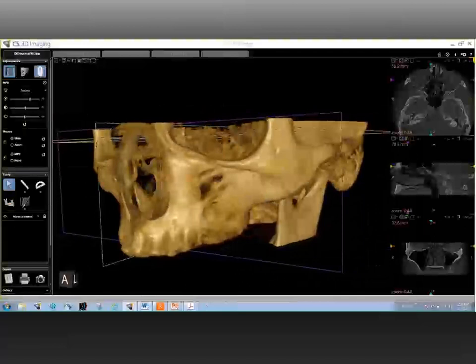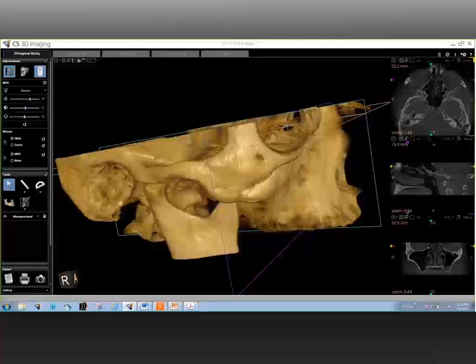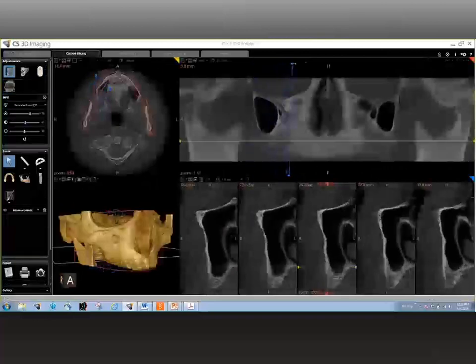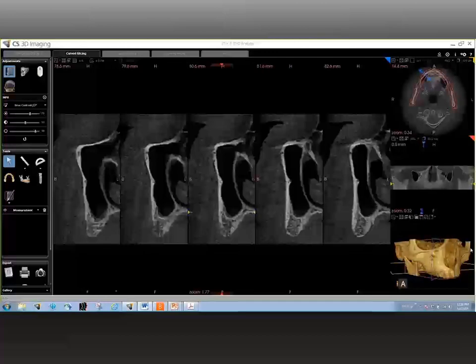Well, Jordan, that is a fairly simple question if you think about it. As with any other hard tissue, one of the most commonly visualized anatomical landmarks is the cortical bone, and by the cortical bone, we are looking at the integrity of the cortical bone as such. The cancellous bone, which is within the cortical bone, and you can see right there the cancellous bone, which is encased in the cortical bone. And then, of course, you have the trabeculation pattern within the cancellous bone, which also signifies the health of the bone by itself and the density of the bone. And like I mentioned earlier, traditional methods of evaluating the density of the bone do not apply, so it's a little bit different criteria.